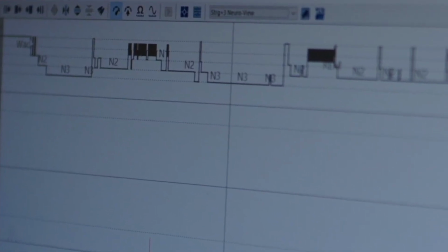This thick band is then REM sleep. You can see it clearly here with the eye movement, right? This thick part here. And we have the deep sleep with our delta waves, right? And in between, we have our light sleep, and very rarely in this patient, our waking phases. Yes, although you are allowed to be awake for a bit. That's often overestimated by the patients, but I would say, or we can agree, that this is now an almost completely picture-perfect sleep profile, wouldn't you? That's the sleep profile that every scorer urgently wishes for.